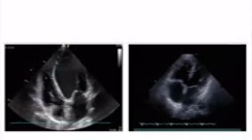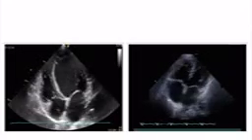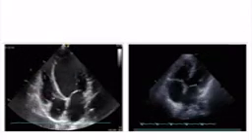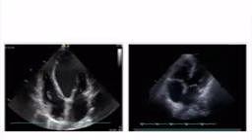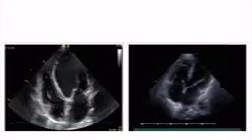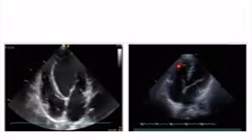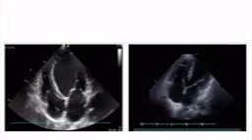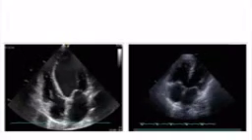We have a relatively small right ventricle on the left with a relatively preserved function, and on the right, again, a dilated ventricle, which is moderately reduced in function.